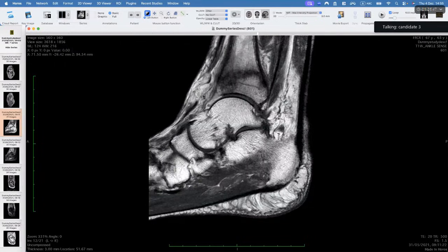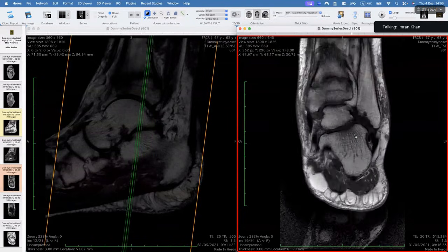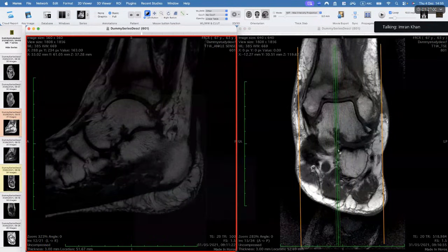Stress fracture. Correct. Okay. So this is a stress fracture. She's 63, female. She's in a lot of pain. There is periosteal reaction there. This was a stress fracture. And she was immediately sent to A&E.